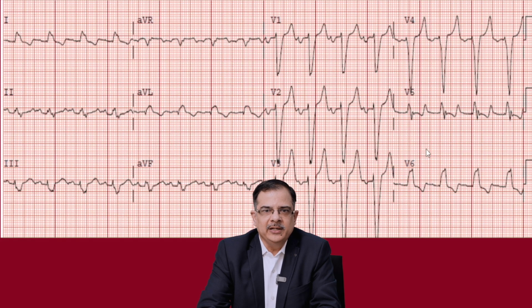So the reason for the reverse S2 split will mainly be late A2, and late A2 will be because of aortic stenosis, where there will be a murmur; or left ventricle failure, where there will be crepitations in the chest or other LV S3 findings or a symptomatic patient. Left bundle branch block can be asymptomatic after myocardial infarction. So for left bundle branch block, we will look at V5 or V6. It will show a wide QRS, absence of initial Q waves, and an M pattern or R dash pattern in the ECG. So let's see, focus here.